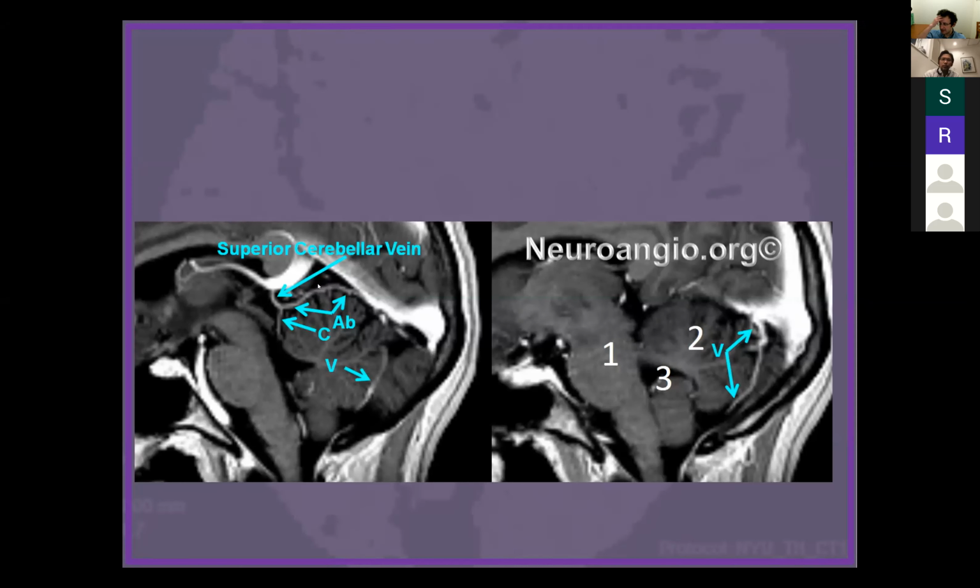In terms of that, these numbers 1, 2, 3 are the things that we generally teach in our training for people what to look for. So when you look at, say, a lateral angiogram of venous phase of vertebrobasilar injection, what you want to try to do in your mind is try to understand where the brain is.